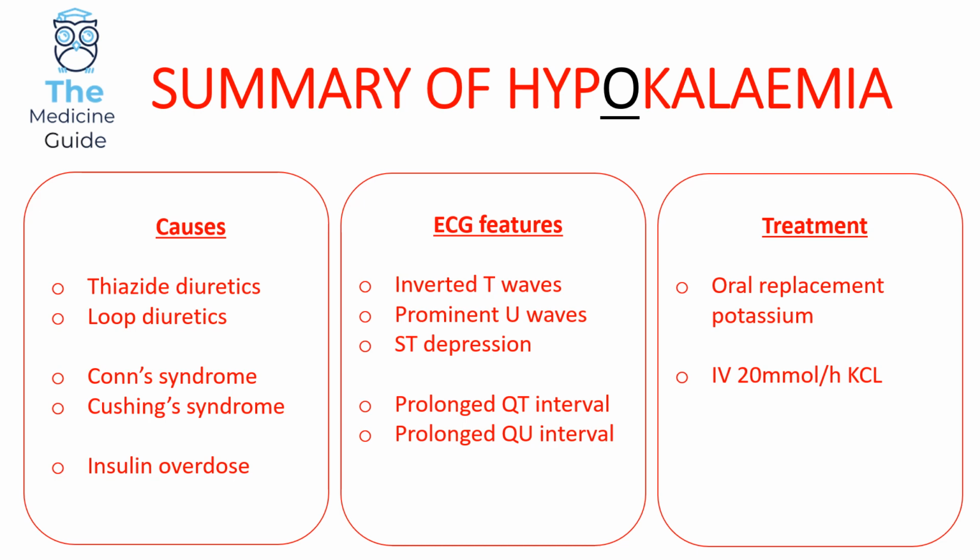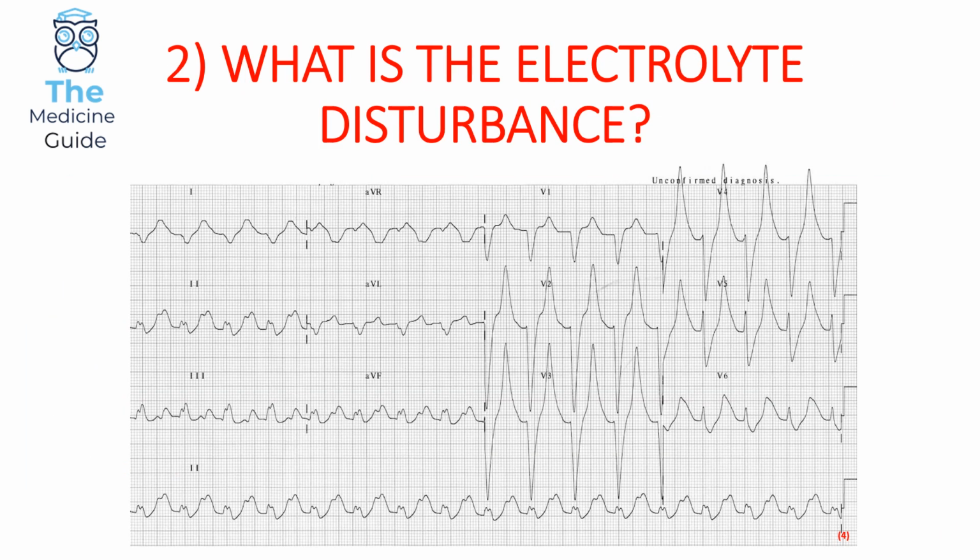Okay, so let's have a look at the next ECG. Again, you can either choose to pause the video here or wait 20 seconds, at which point you'll be given the answer.